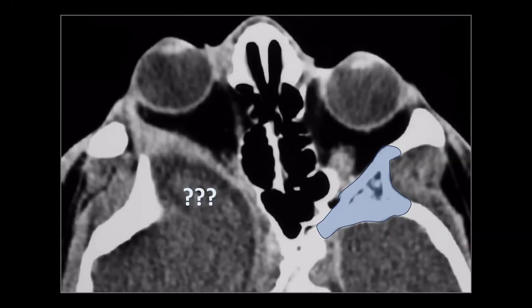This is not something you will see frequently, but if you see it, it will be almost always in one specific pathological condition, namely neurofibromatosis type 1. Neurofibromatosis type 1 is a genetic condition characterized by the presence of, for instance, neurofibromas, very small benign tumors of peripheral nerves, and that's why they call it neurofibromatosis, of course. But in 5 to 10% of these patients, the sphenoid wing, generally unilaterally, will be dysplastic or even missing. This is sphenoid wing dysplasia, and why this occurs in these patients is actually a bit unclear.